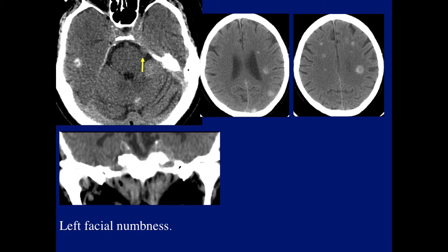Not mentioned before, somewhat of a wild case. Could be multiple cavernomas, but it was not the case in this patient. Was not sarcoidosis, another interesting good possibility. What if I told you it was a man?